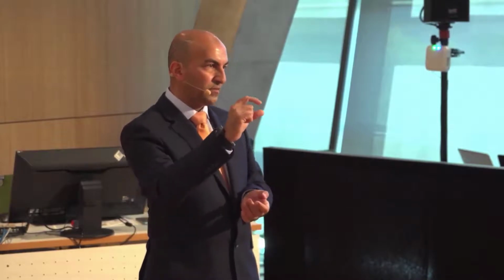But I'm thinking that I've got a lot of new users here, so I'm going to show you the straightforward steps. What you're asking for is something that I'd modify by opening the bite, building the restorations to that new bite, and then fitting them accordingly. So I might do one quadrant one day, and a couple of days later I do the other one to build it back to the new bite, and that's how you can raise the OVD by 1 or 2 millimeters, however much you want.